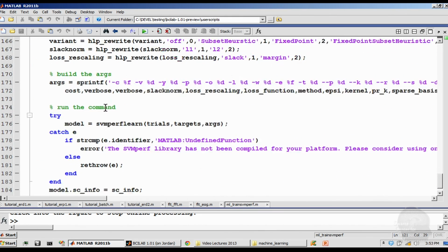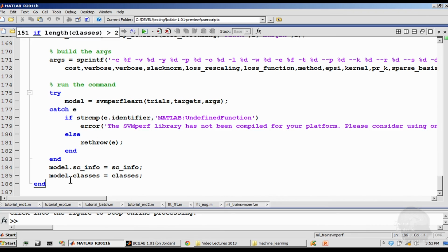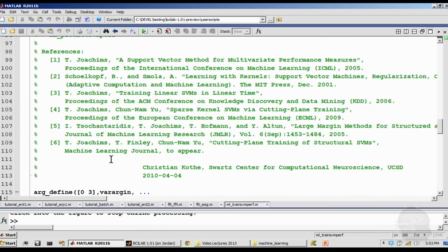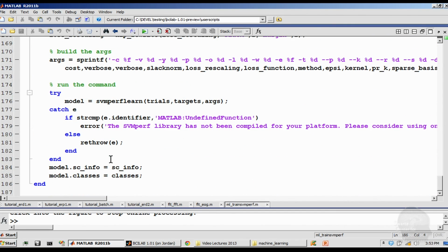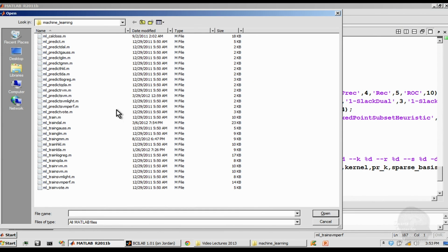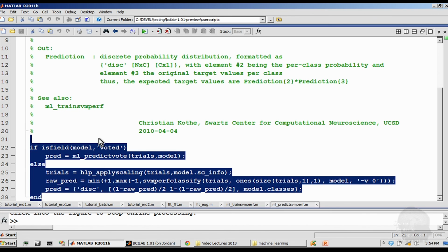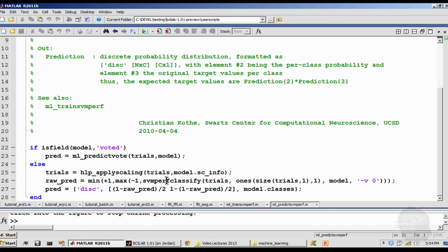And here's a little bit of coding. Basically, this plugin just calls the dependency. So it's 180 lines, and that's very easy to get this into the GUI and all that. And that's why actually there's so many methods in the toolbox, because it's very little coding overhead to make some. And the associated prediction function for this machine learning method, the second function, is probably even shorter. So it's this here, which outputs the predictions. It also calls some function of some dependency in C++ or so, I guess.